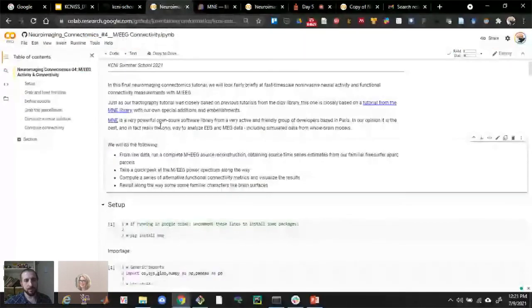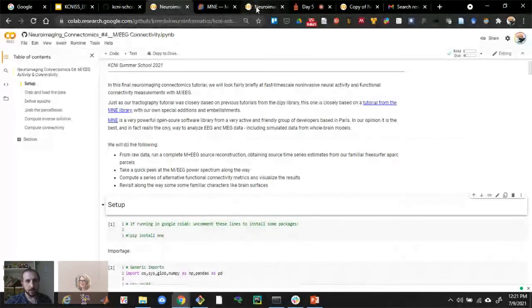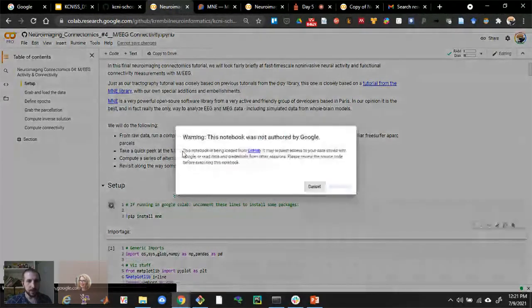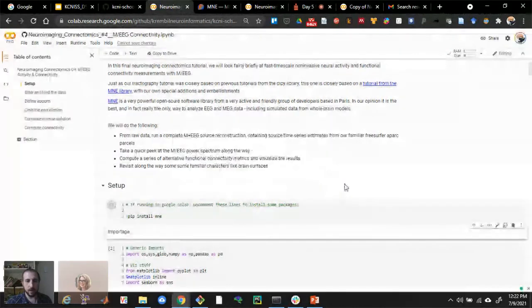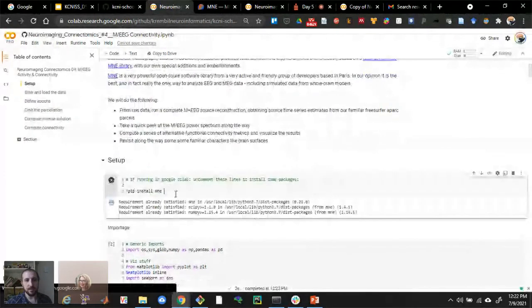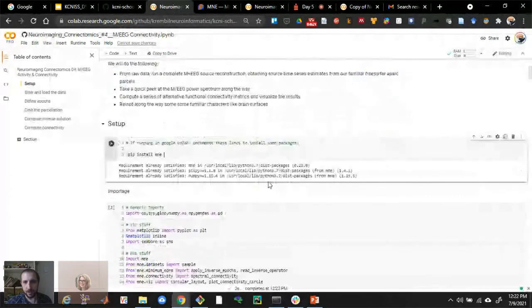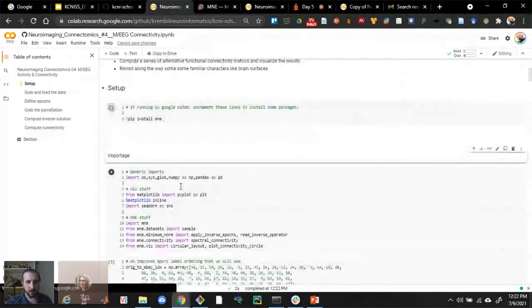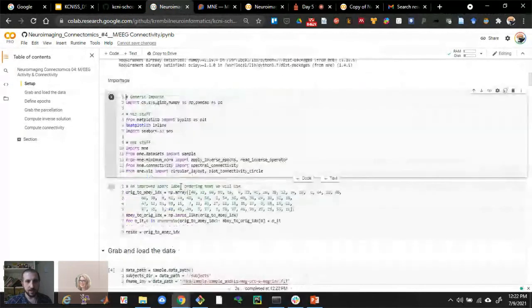We're in Colab again. Oh, this is the right one. Let's do this one. Yeah, this is right. As before, we need to do this pip install, and the only non-standard library we're using here is MNE. Colab recognizes that I've already been here in my browser, but I'm starting a new instance. So we're going to install MNE. The rest of the stuff we're going to use is the standard scientific Python stack. So we're just going to import, as previously, some visualization things and some MNE tools.